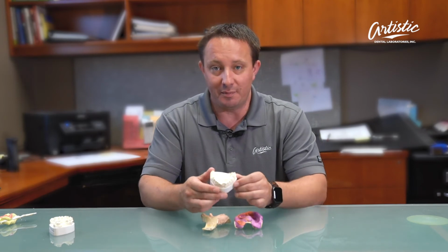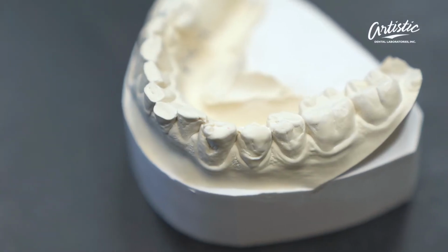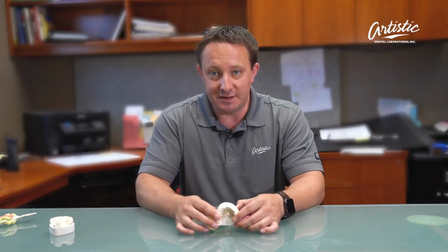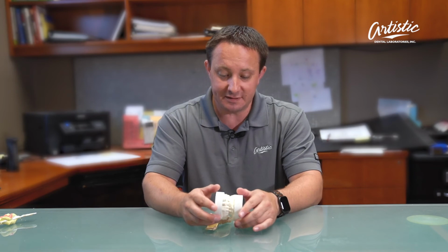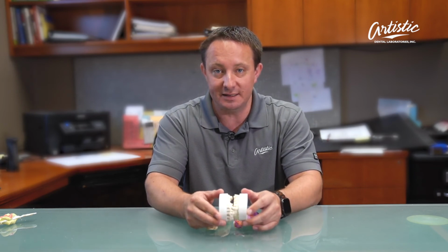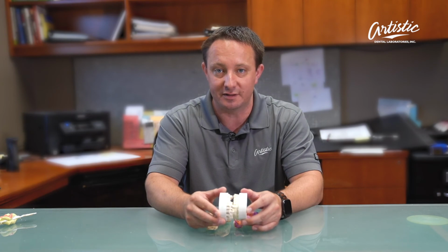So when I pour the model, you can see along the incisal edge right here where the distortion is and where the teeth have actually protruded out farther than where they actually may be. The funny thing about these impressions is they're actually for the same case. So if I take these two models and put them together, you're going to see that I don't have proper occlusion in the anterior where I need to make those restorations. This is going to result in heavy adjustments chairside or a complete failure of the product.